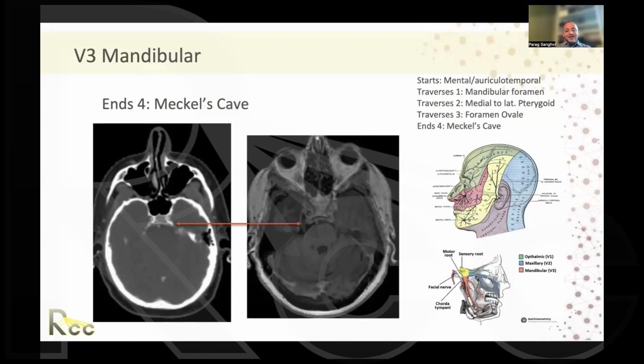Be generous. If you're using a brush, use a thickness of at least 1 centimeter, sometimes even larger. Don't just draw a very small line. You want to make sure that you're covering. Remember, the nerves have lots of unnamed small branches. So it's not just covering the nerve pathway, but some of the smaller branches that are going to be right next to the nerve for these patients.